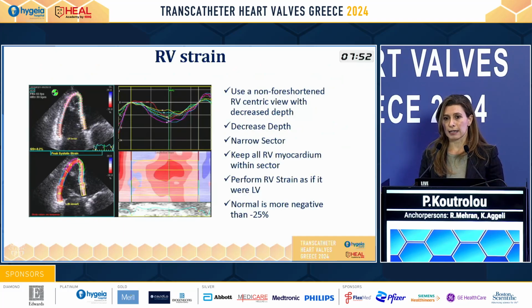RV strain is a measurement that we do. It's actually an easy measurement that we do in our everyday life. We used to do it for the LV, but in the last many years we do it for the RV. It's, I would say, a measurement that is easier to do for the RV than for the LV. We actually do the same thing. We use a narrow sector, but we make sure that we have the whole RV in our plane so as not to miss a few segments. We have, however, our sector as narrow as we can so as to have a high frame rate.